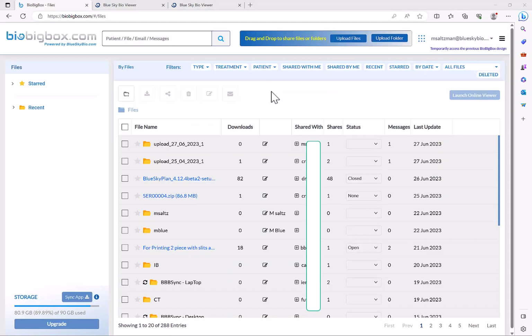So if you're using LabPronto to outsource your lab work, or if you're using Blue Sky Monitoring to monitor your aligner cases, any of the data that goes through those systems will show up here as well. So the data that you send to LabPronto or get back as completed cases will show up in your BioBigBox account. The monitoring scans that come in from the patient will show up in your BioBigBox account. So all your data is going to be organized directly in your BioBigBox account. And we have the drop downs that you could use as well in order to access and get to the relevant information quickly and easily.